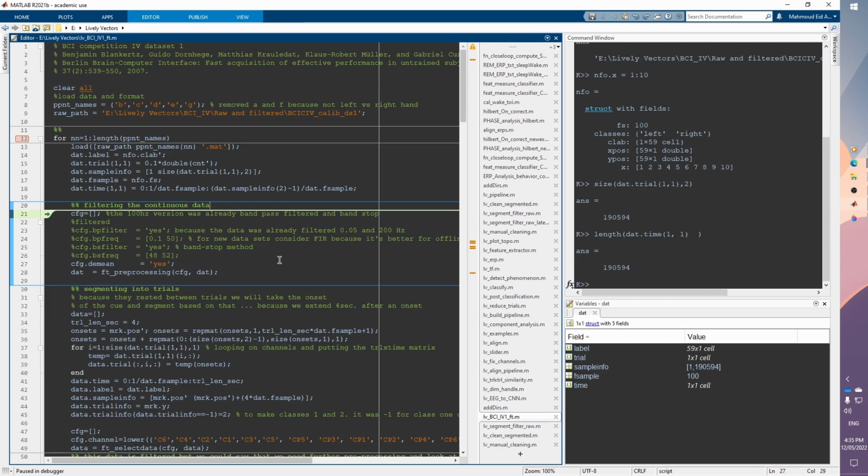So basically what I'm doing here, because our data set in this example is simple, I'm just using some already existing filtering directly, and the dataset here is already filtered, so we don't actually need to filter the data. So I'm just including this if you would like to see how it looks in FieldTrip and how we can use it.